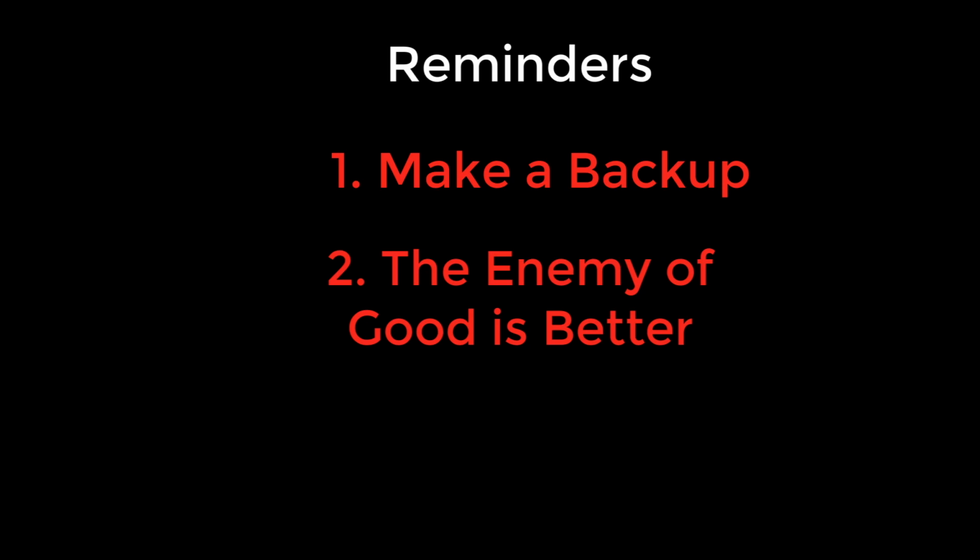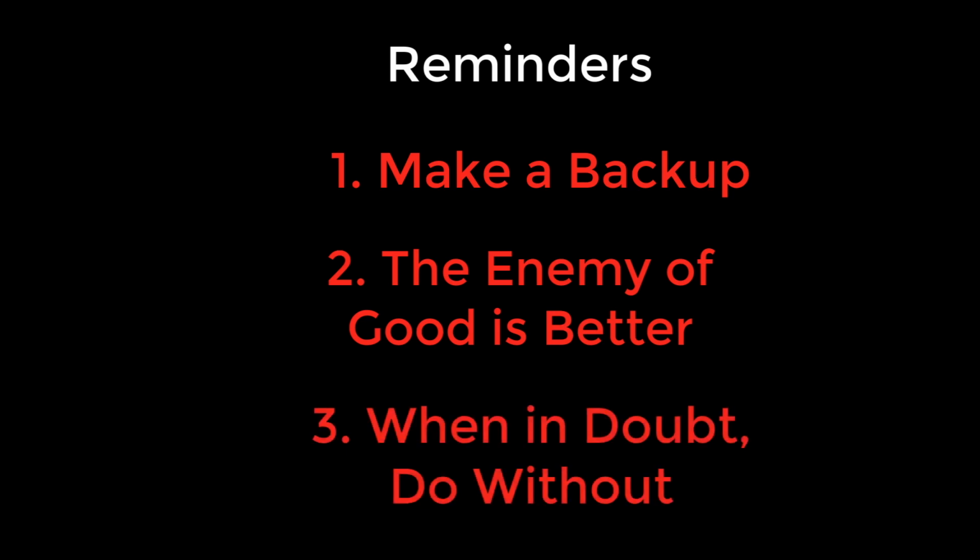If you find yourself having to make many edits per subject, this is most likely a problem with your data quality, and it should be fixed at the scanner, not in FreeSurfer. Lastly, if you're unsure of whether to make an edit, don't do it. Remember that we're editing 3-dimensional volumes, and what looks like a problem in one slice may resolve in the next slice.